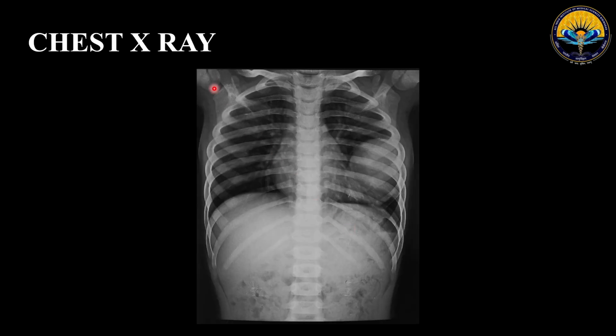So it is a frontal chest radiograph, PA view, of an immature skeleton showing a well-defined, rounded, homogeneous radio-opacity involving the left mid and lower zone of the lung field abutting the left lateral chest wall. There is no evidence of mass effect in the form of mediastinal shift, no calcification or air lucencies within the radio-opacity, no pleural effusion in the form of maintained costophrenic and cardiophrenic angles, no obscuration of the cardiac margins, and no evidence of pleural thickening on either side.